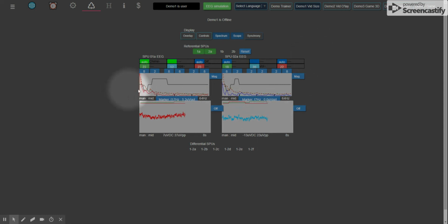All right, so what do we got? To do the feature extraction, the key point is this black line running through here. Positive deviations represent frequencies that will contribute to a reward. Negative deviations represent frequencies that will contribute to an inhibit. This here is in fact called the protocol profile for channel 1 and the protocol profile for channel 2. All frequencies that fall here will contribute to an inhibit. The rewards and the inhibits are up in this section here.